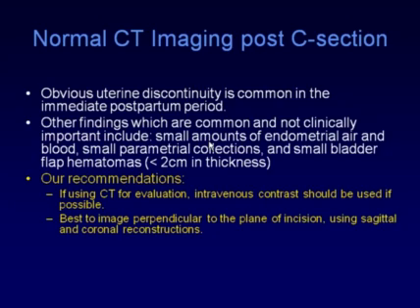Our recommendation, if you're using CT for evaluation, is that intravenous contrast should really be used. If for whatever reason IV contrast cannot be given to the patient, CT may not be the study of choice at that point. In addition, it is best to evaluate the uterus perpendicular to the plane of the incision, and typically that requires making sagittal and coronal reformatted views of the uterus.